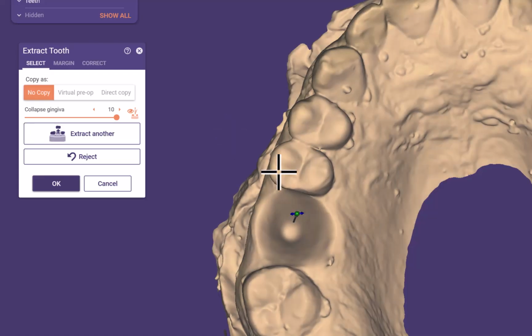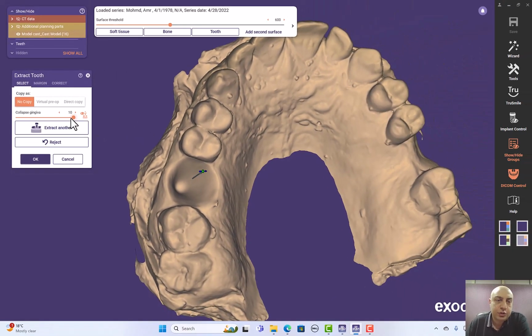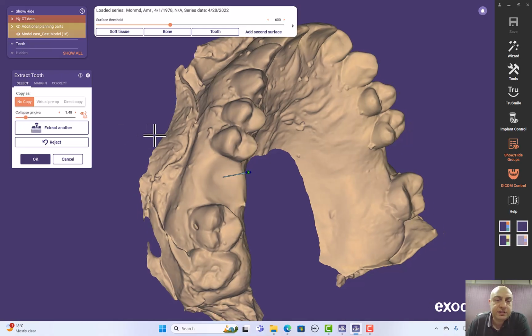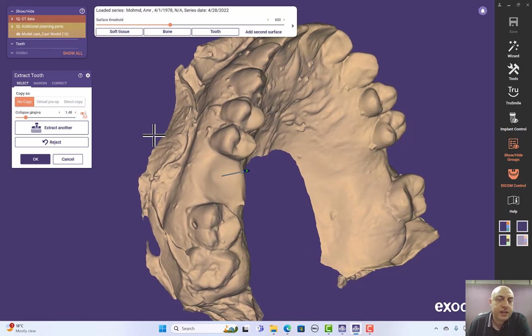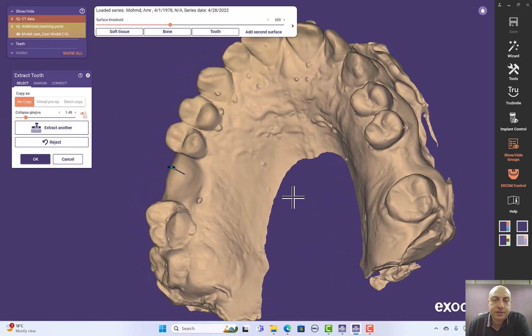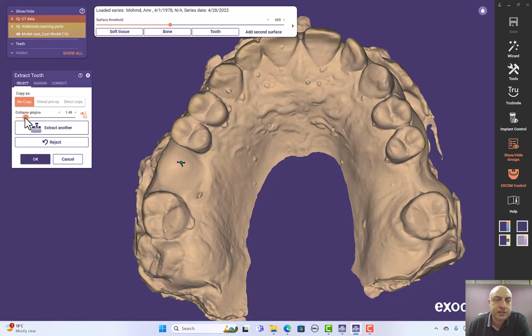I don't want to leave this deep socket because I'm going to draw the guide, and I don't want any protrusions or extrusions inside this area. So I will keep it midway, but somewhat close to the left, because I don't want interference to happen.